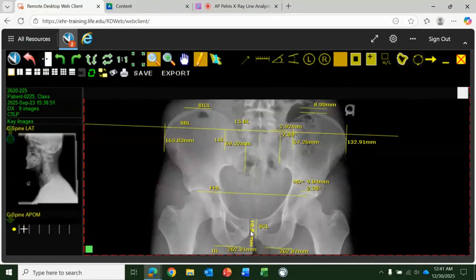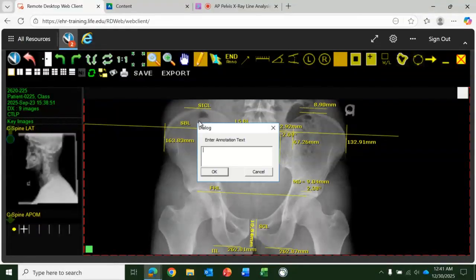We then check to see where the symphysis pubis went regarding the sacral center line. And we're comparing it to the left side. So the symphysis pubis went on the inside of that sacral center line instead of the outside. So that is an IN. Since the numbers are close, we're going to round up to 1. So we place the listing in the ilia, and we have an AS1, IN 10.